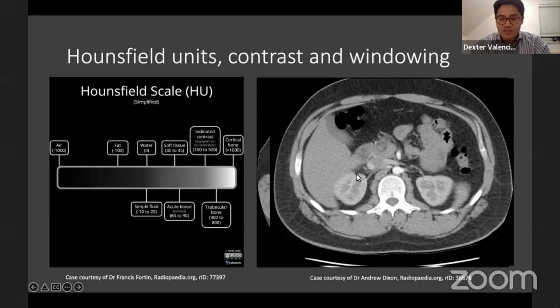So you often can see things such as the top of the right and left kidneys. You can start to see a little bit of this structure, which is the right lobe of the liver. This structure here, which looks a bit blurry, we're starting to skim the gallbladder. And these things, which look quite circular and black, if you imagine outside the patient, there's nothing there, so that's going to be gas. So this is a structure within the abdomen, which has pockets of gas within them.